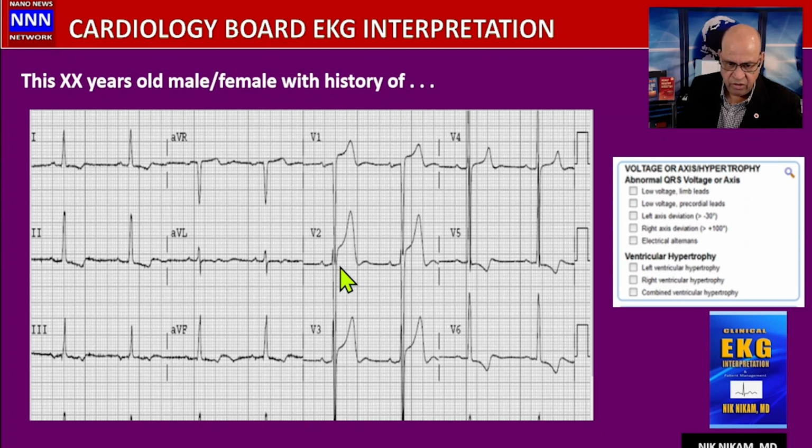All right, here's an example of another left ventricular hypertrophy with strain, and look at the ST segments here. They look like 5-6 millimeters, but that's a normal variation. So it is not suggestive of hyperkalemia or acute myocardial injury, but this is part of the left ventricular hypertrophy. The best way to know if it has any significance is to look at the previous electrocardiograms, look at the presentations, and obviously the clinical presentations and lab tests will prove that to be part of the normal changes that we see with significant left ventricular hypertrophy with strain.